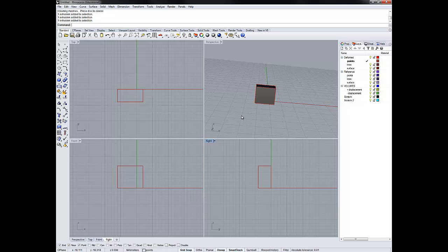There's another advantage of Rhino, and it's the middle mouse button as the pop-up menu. When you hit the middle mouse button, you get this pop-up. A number of the functions that we'll be using frequently are actually in this pop-up, which is included in the template file that you'll be able to open. So you can just close this in order to move on.